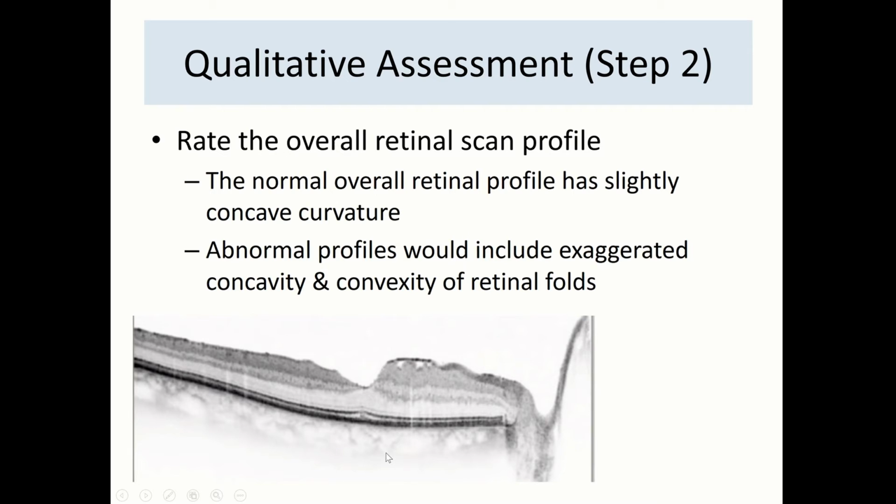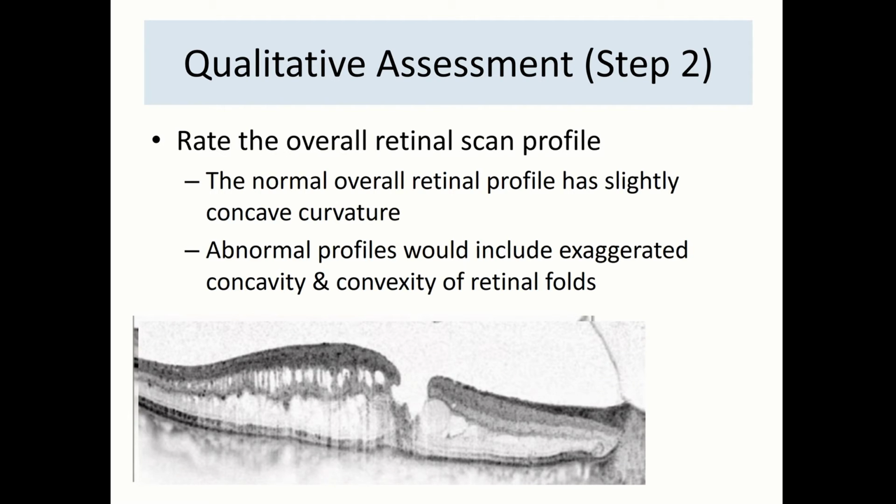So you need to check the retinal profile. So here the retinal profile becomes slightly different. Here you can see, if you see this retina, you've got thickening of the retina. There is splitting at the fovea of the inner retinal layers. Then there are fibrous bands between the different layers of the retina, and there's loss of retinal fibers or details in the temporal side compared to the nasal side. You've got the inner and outer nuclear layer bands present, while on the outer side there doesn't seem to be any, which signifies this looks like a patient with retinoschisis.